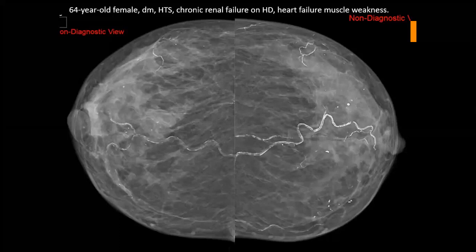It is more on the right side, but might be relevant, but the edema sometimes is gravitational. If the patient is lying on her right side more than left, in a systemic cause, you might find gravitational or dependent edema on one side more than the other. But here, since we have suspicious findings and the edema is more, we have to consider it.